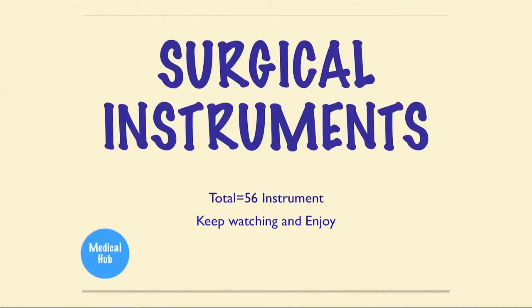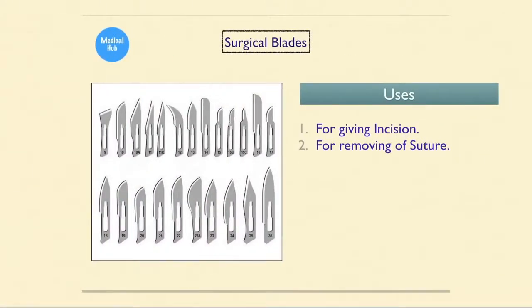Okay, so hello friends, today we will discuss the surgical instruments. We will discuss surgical instrument names and their uses. We will discuss a total of 56 instruments. Okay, so let's start. We will start with the surgical blades.